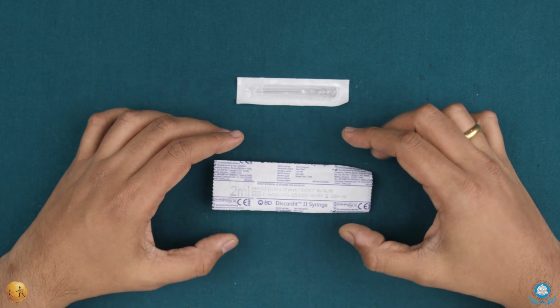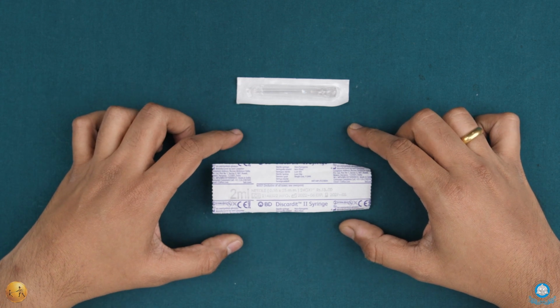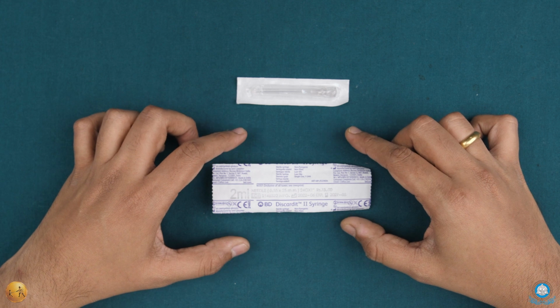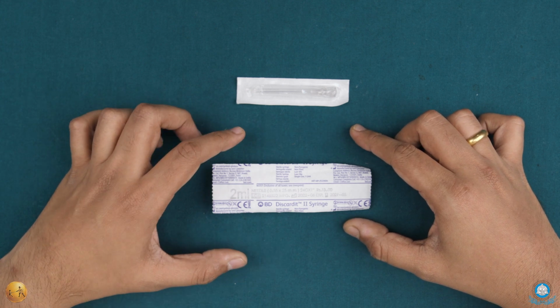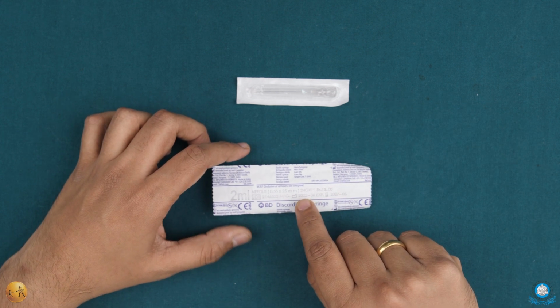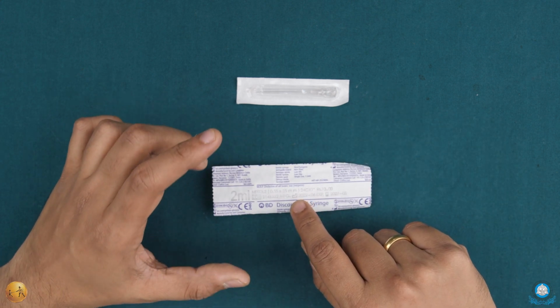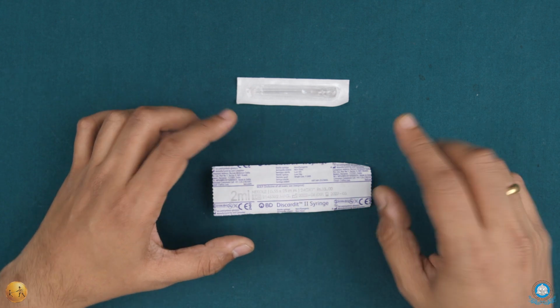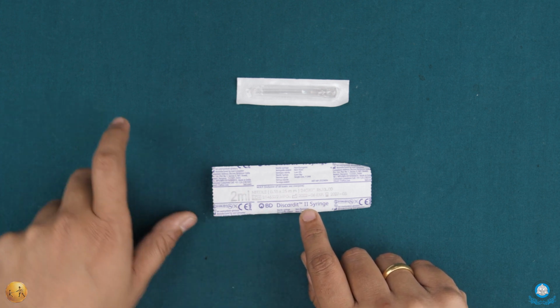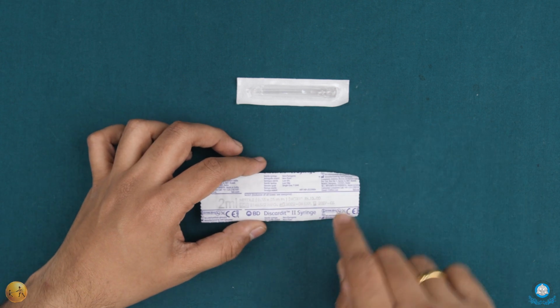Now please remember, the gauge of a needle is a measure of the diameter of the needle itself, particularly the internal diameter. Now the gauge is a number that is inversely proportional to the actual diameter. What that means is, as the gauge number increases, the diameter of the needle decreases. In other words, a needle of 24 gauge is going to be thicker than a needle of 30 gauge. At the same time, a needle of 24 gauge is going to be much thinner than say a needle of a 14 gauge. Okay. Now with that basic difference in mind, let's go ahead and understand the symbols.